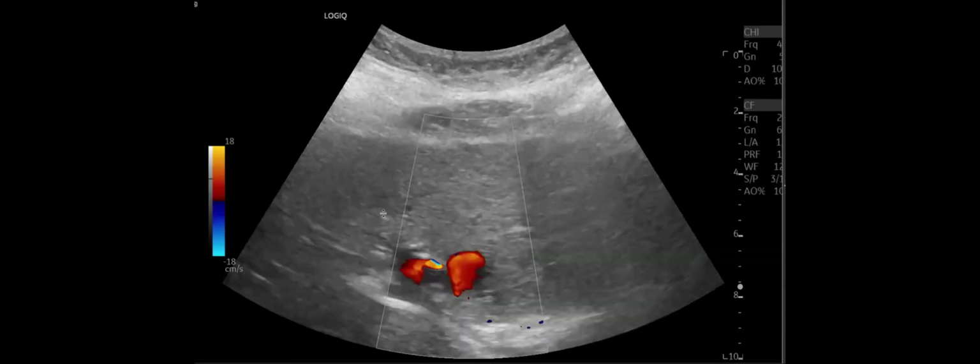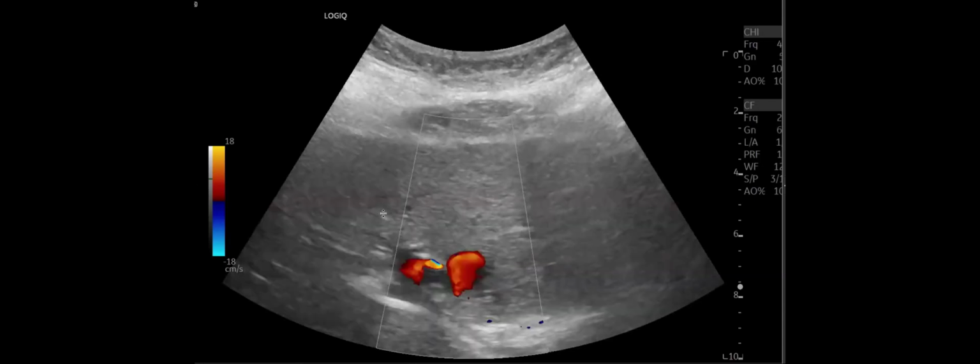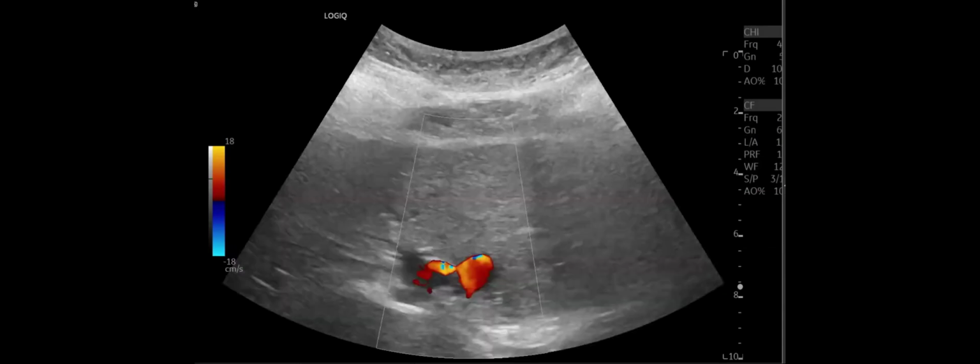And I'll tell you what it was. Let me pull up the ultrasound. Okay, hold on. These are the ultrasound findings. There's flow in it. Wait, is that a lot of flow right there? Like a pseudoaneurysm? Wait, that doesn't make any sense.